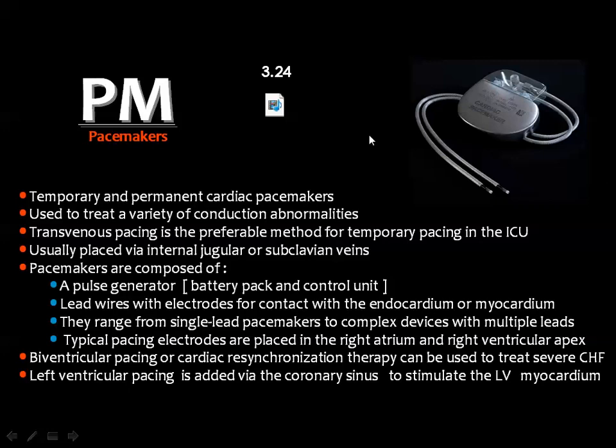These pacemakers are temporary and also may be permanent for treating a variety of conduction abnormalities in the heart.